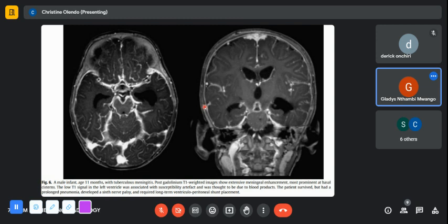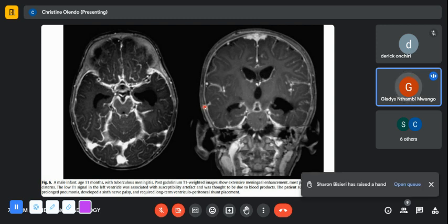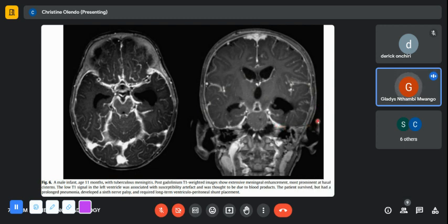In terms of differentiating, with the pachymeningeal, you're looking at whether it's just the dura that is enhancing or just the leptomeninges. That one we have agreed is already there. Because you can see, right round in the coronal, the dura is enhancing. And then you can also see the leptomeninges, what is going in between the sulci, is enhancing. But just look at what is going in between the sulci. Is it just a linear line or is there something more?